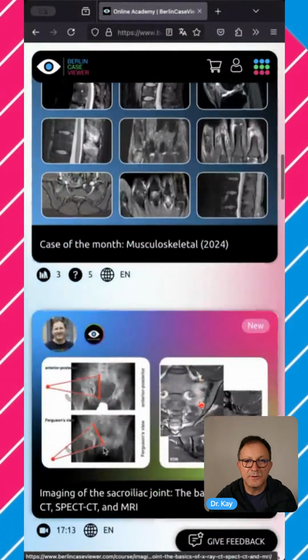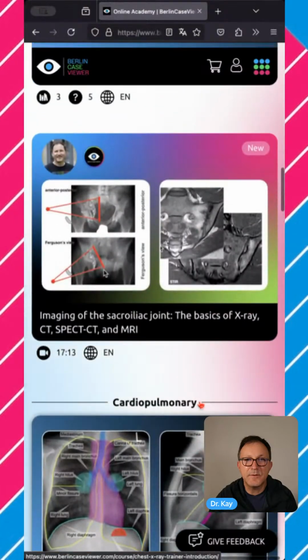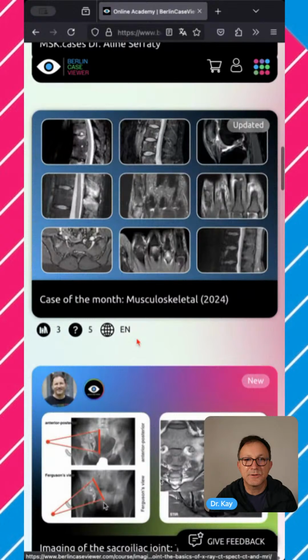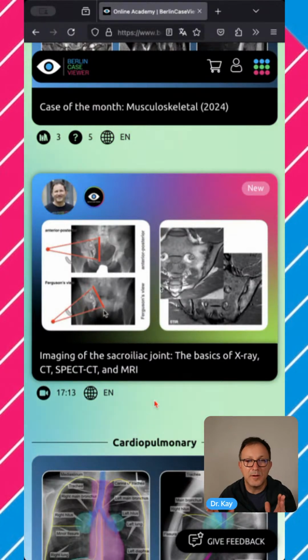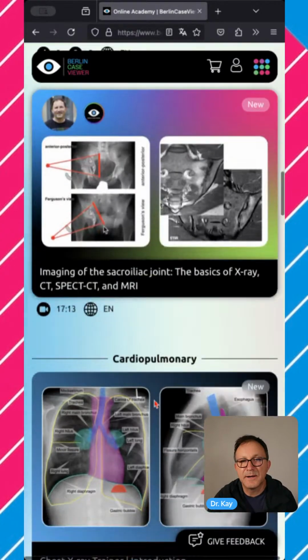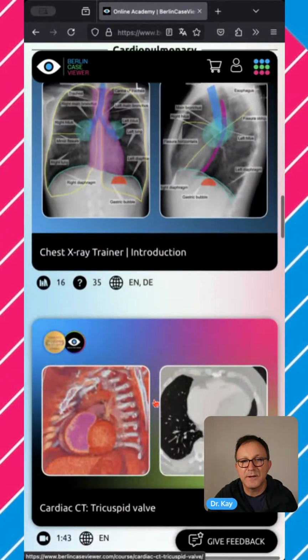I will select a specific one, and then we have also video lectures. So you see, while that is a case collection with the number of cases presented here, we have a video lecture, and this video lasts 17 minutes and 13 seconds and is provided in English. So you can have a mixture in our online academy of case collections and videos. I think that's a very, very worthwhile method of training.